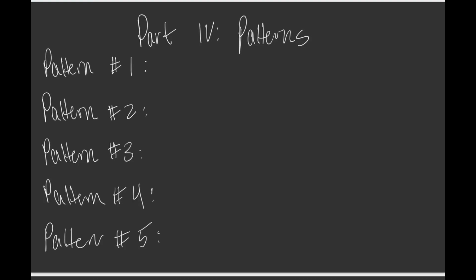And if we remember, leads 1, 2, and 3 all had something in common. What was that? It was that the right side of the 12 lead, right, so leads 1 through 3 should be all positive.